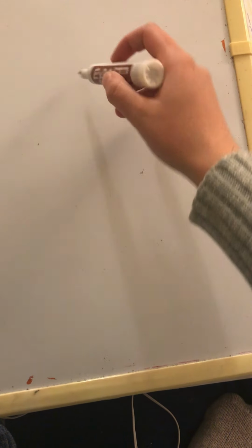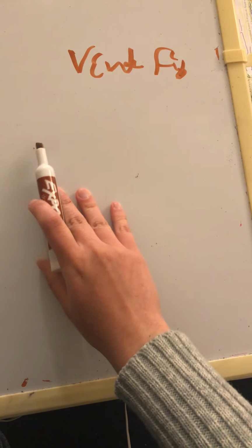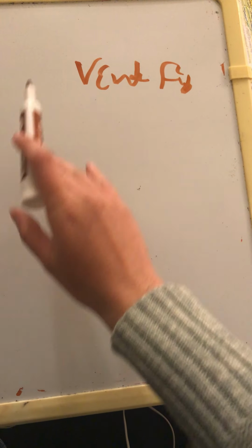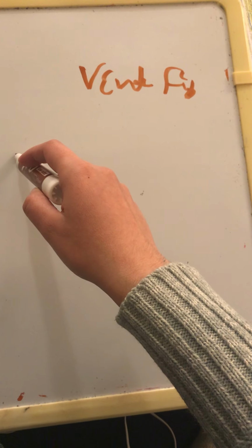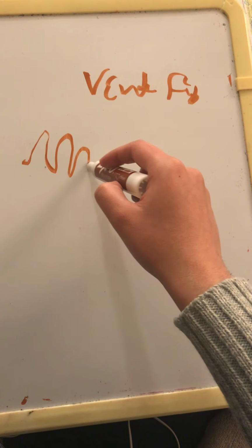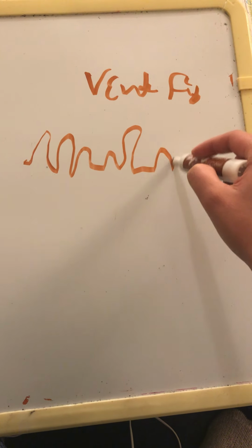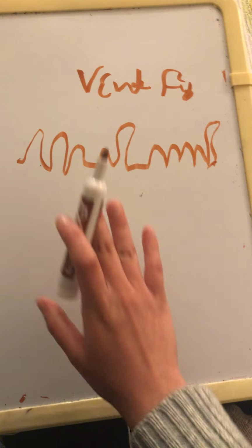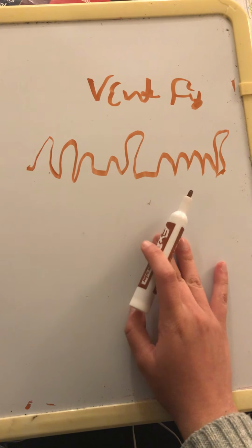Now we're going to see ventricular fibrillation. The trace that we're going to see, the strip, has no clear QRS complex and is totally irregular. It has no sense. Not to be confused with torsades de pointes, which goes up and down; that's the other thing.